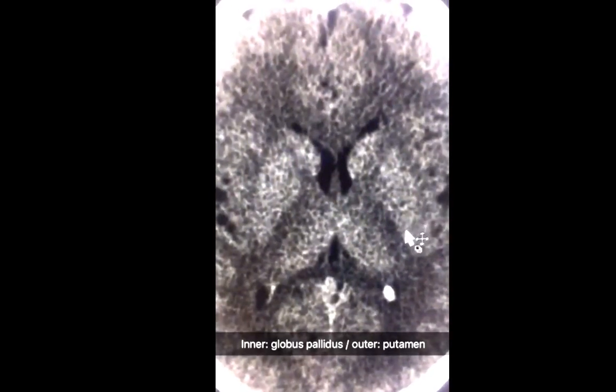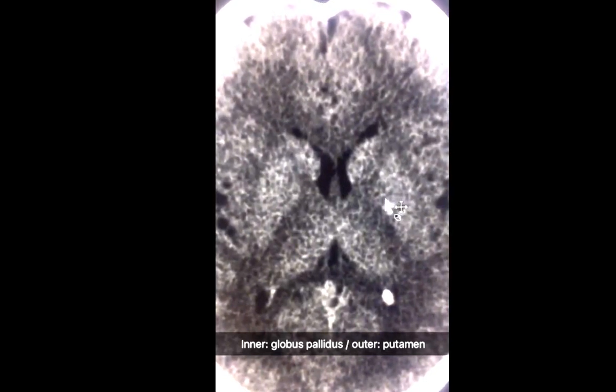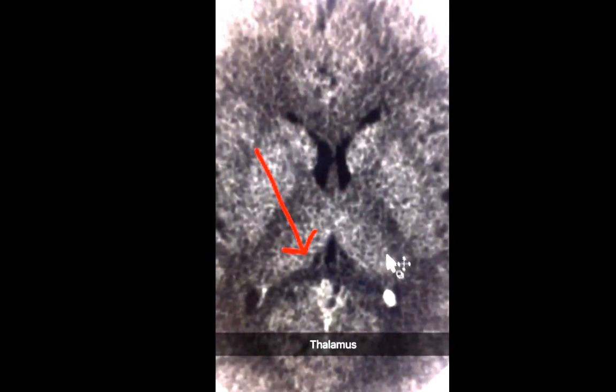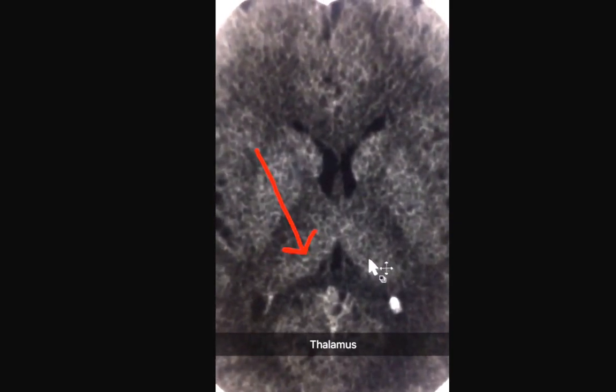The lentiform nucleus is composed of two parts which are difficult to differentiate on a CT scan, the inner globus pallidus and the outer putamen. Going more posteriorly, you'd see another focus of gray matter. This is called the thalamus.